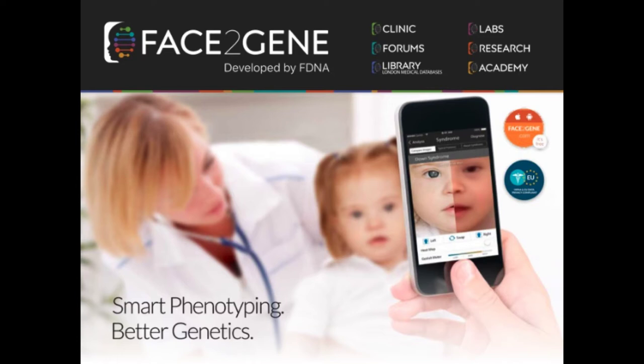Today I'm going to show you Face2Gene Clinic and Face2Gene Forum on the web version. You can also access the mobile version by finding the Face2Gene app in the App Store. The purpose of this video is to walk you through the process of adding a new patient case and getting you comfortable with some of the features inside Face2Gene.